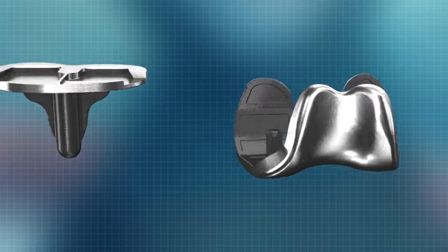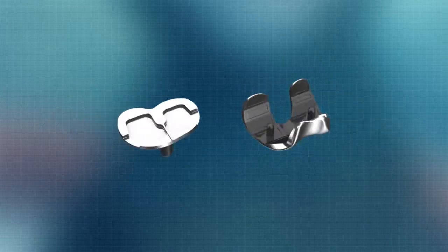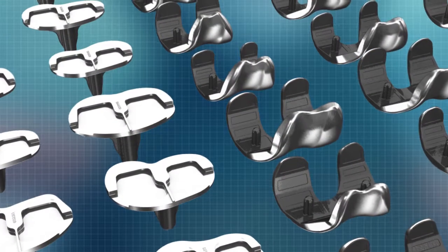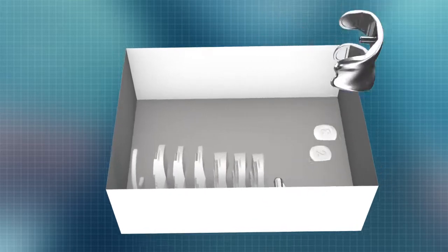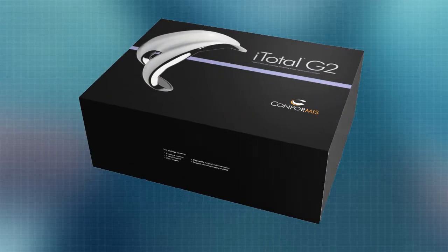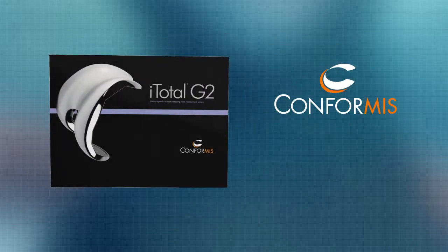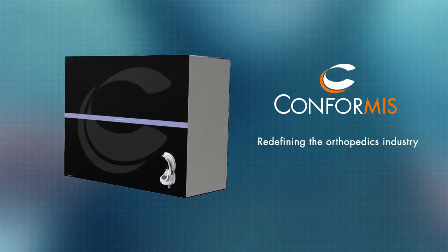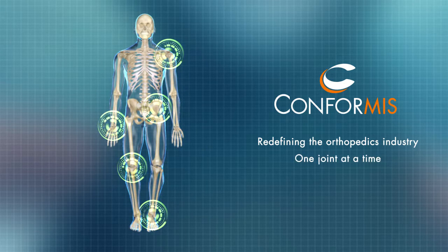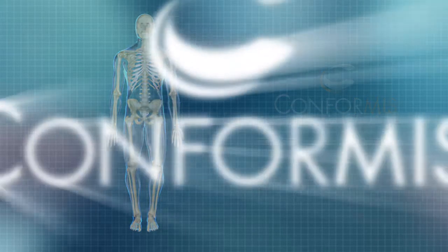iFit design and manufacturing technology enables mass customization, a term foreign to the orthopedic industry. Unlike any knee replacement available today, Conformis customized implants and iJig instruments are delivered pre-sterilized in a single box before surgery, greatly reducing hospital costs associated with implant storage and instrument sterilization. Simply put, iFit technology and just-in-time delivery model put Conformis in a class of its own with unparalleled speed of innovation.